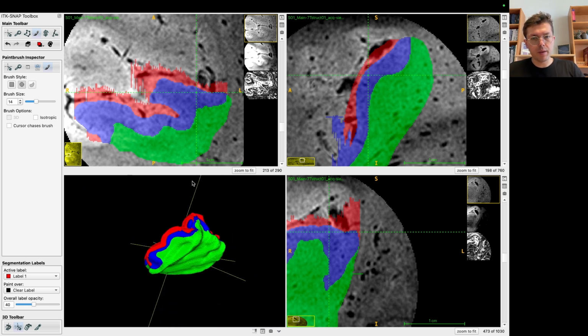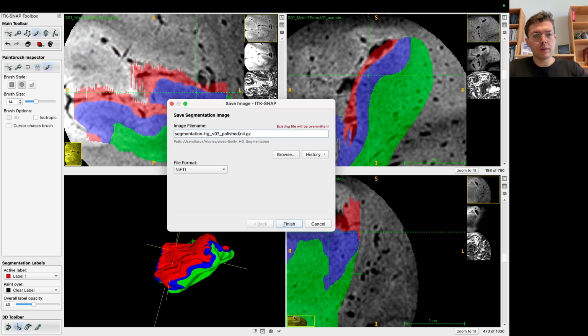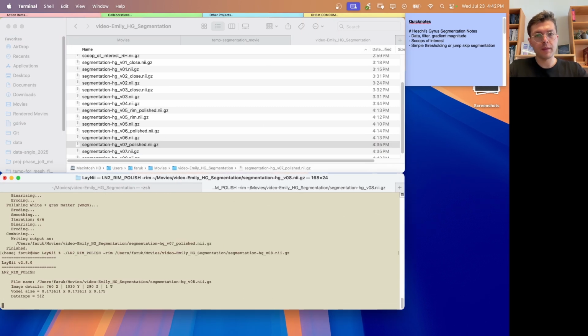Okay, nice. Save it as version 8. Now I'm going to run rim polish on it again.